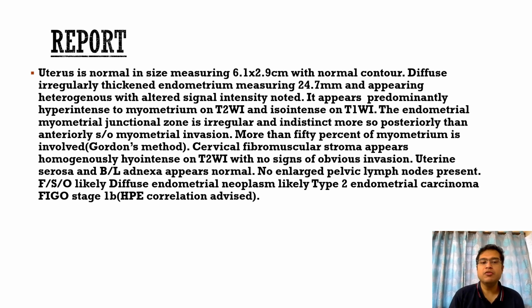More than 50% of the myometrium is actually involved in this particular case, as calculated by Gordon's method, which I'll be showing in my next slide.